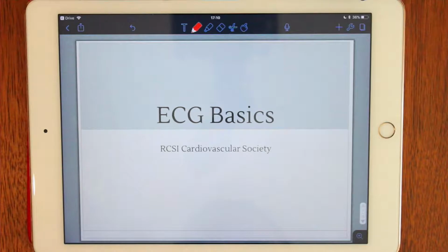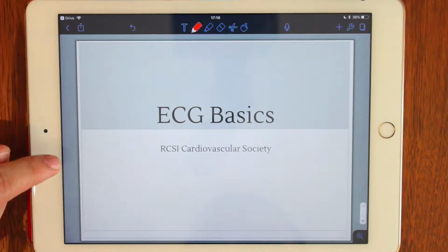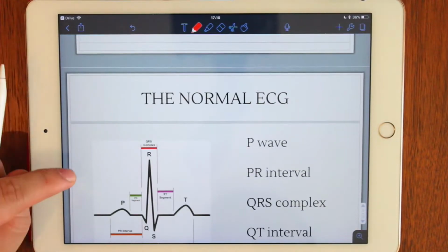What we'll be doing today is going over our approach to general ECG interpretation that we'll be using in each subsequent tutorial. In those tutorials, we'll move quickly through the interpretation, so if you'd like a more detailed explanation for any of those rhythms, come back to this video to see detailed explanations of every step.